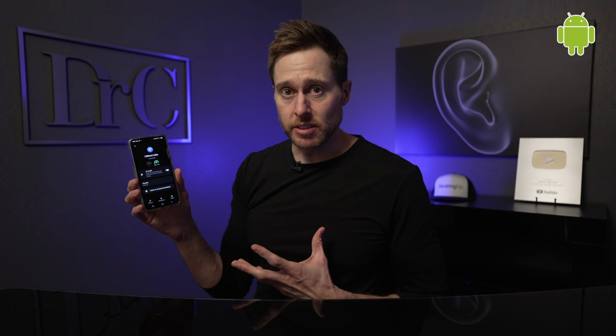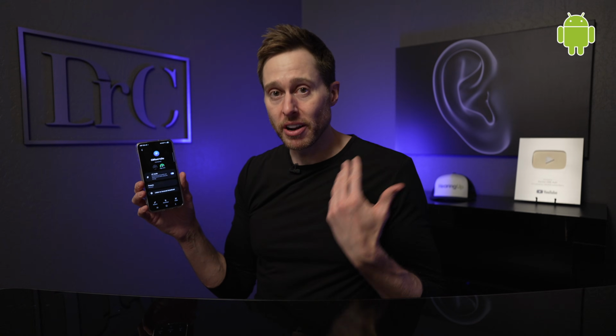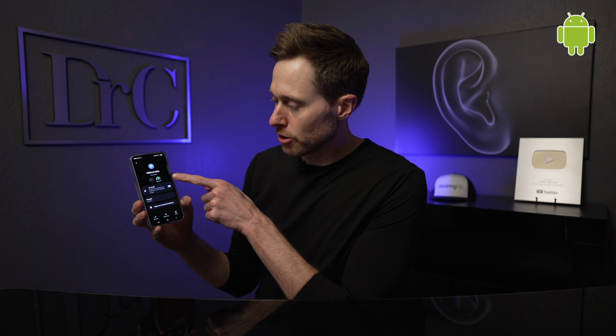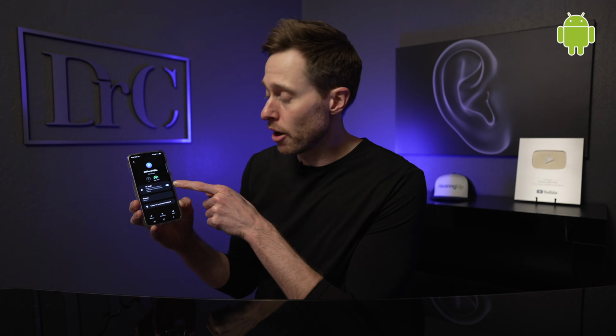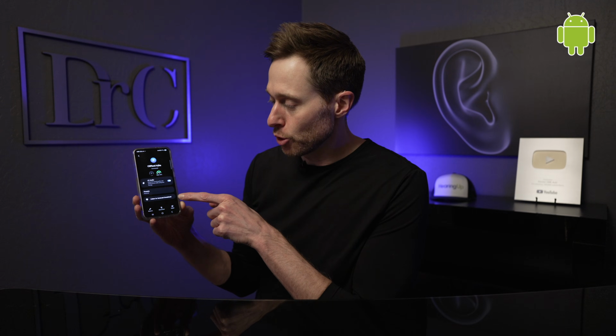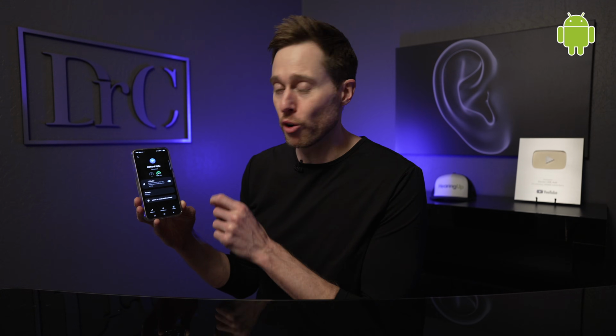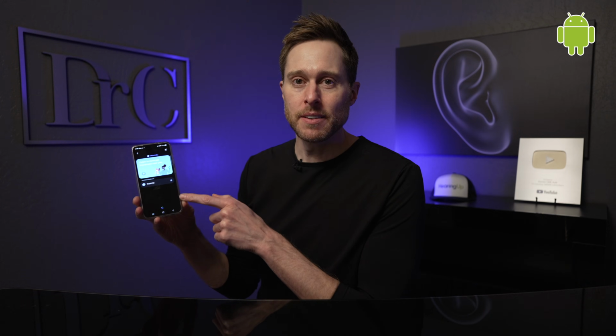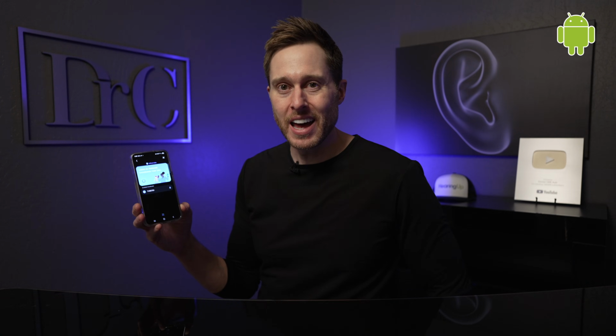Now the cool thing about this is that I can tap into an Auracast broadcast signal with my Starkey hearing aids. We click on this little settings wheel here off to the side, and you can see here that we are using LE audio Bluetooth, and here we have the option to listen to an Auracast broadcast signal. So if I tap on that, it'll show you any available broadcasts, and then you can go ahead and get access to that broadcast audio.